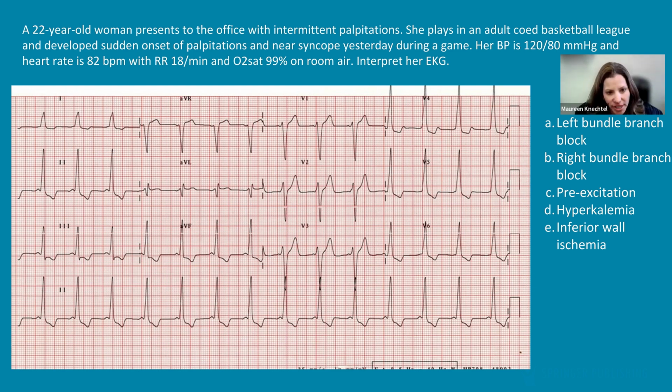Okay. Oh, hyperkalemia. That's a great thought. So the answer is pre-excitation. The most commonly chosen answer was hyperkalemia, followed by pre-excitation. So pre-excitation is the correct answer. I'll tell you, this is a hard one. I'd call this a challenge tracing, but it's also one of my favorite topics to talk about. And I would say this is also a can't miss EKG.